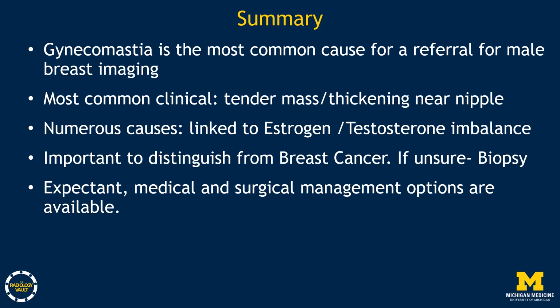In summary, gynecomastia is the most common cause for a referral for male breast imaging. The most common clinical scenario is that of a tender mass or thickening deep to the nipple. There are numerous causes which are linked to an imbalance of estrogen and testosterone. It is important in imaging to distinguish from breast cancer, and if you are unsure, then biopsy can be performed. Expectant, medical, and surgical management options are available.